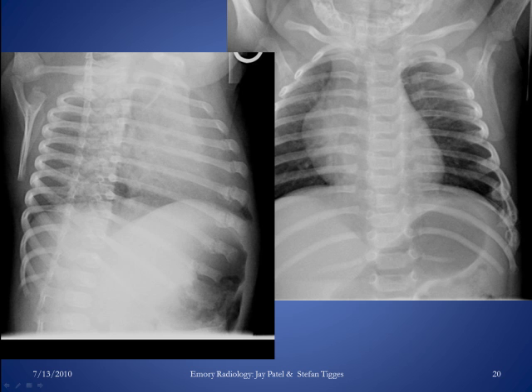The fact that they're kind of lateral, some of them kind of posterior, strongly correlates with abuse because the mechanism that generates these fractures is relatively specific. Other fractures that are very concerning are first rib fractures. Those are considered virtually diagnostic of child abuse since they require considerable force to produce.